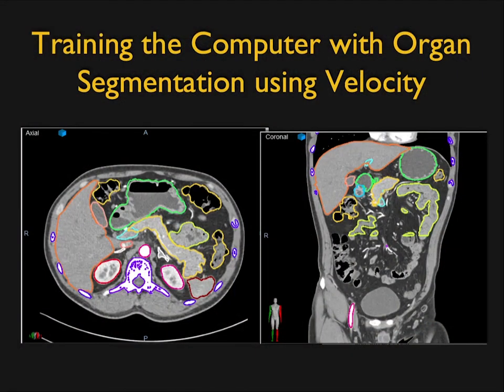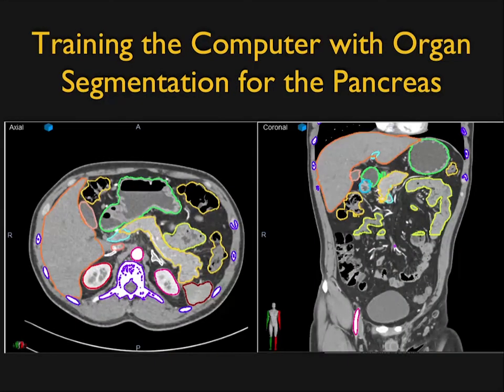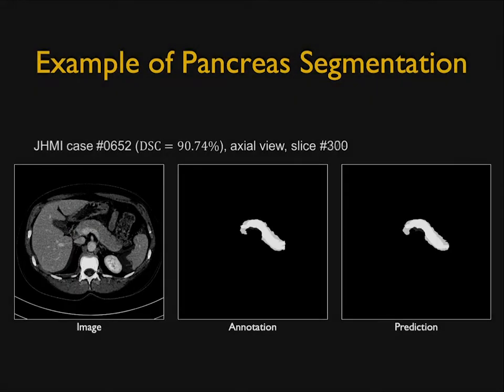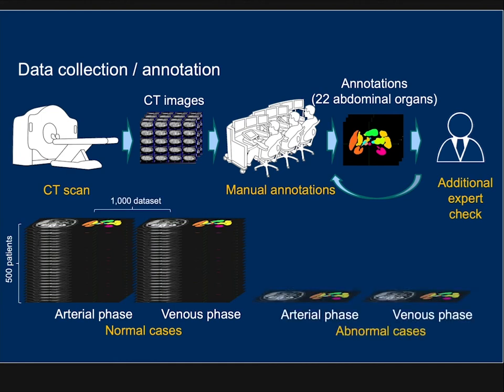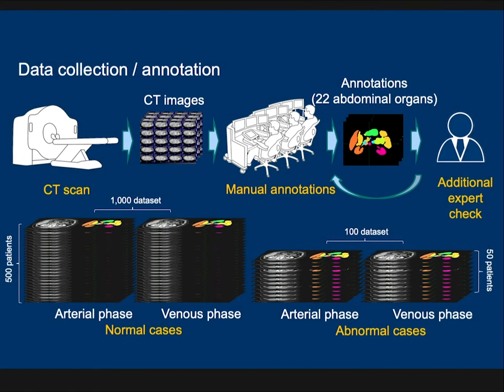And then, of course, I've spoken to you about the Felix project, where we taught the computer to find the pancreas, find the organs, segment them, understand what is normal, and then understand what is abnormal. The computer is one-to-one for detecting the gland and its boundaries. And now with 95% accuracy, we can not only find the gland, but we can look and determine what the lesion is. So you can see here very nicely shown how you think about the process of normal to abnormal and how the computer needs to be trained, but the future really is that.